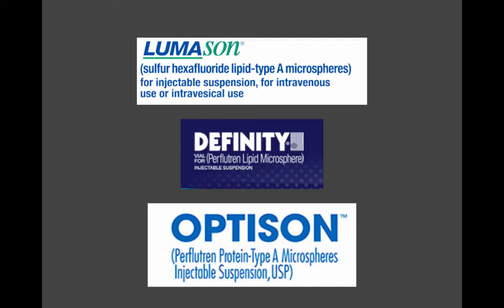Contrast is another advancement that's been made. Contrast is used pretty extensively by cardiology. The folks at our hospital really like using the contrast to help them delineate the left ventricular function, left ventricular cavity size, and any abnormalities like apical thrombi. It can be very helpful. There's a couple different brands. Again, I don't take money from any of them, but it's kind of amazing the enhancement that you see when some of these are used.